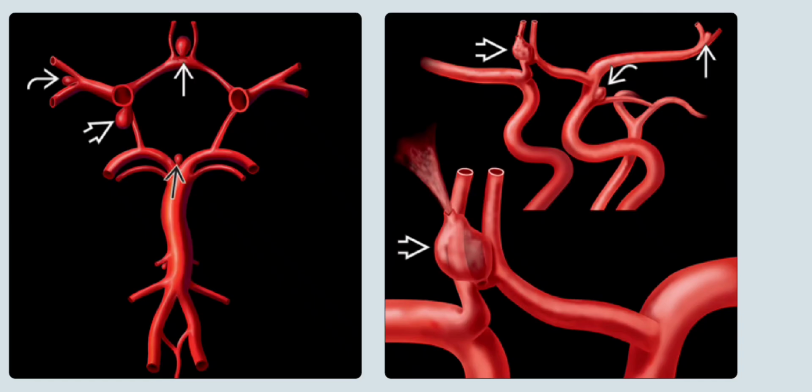So coming towards aneurysms, these are the cases of saccular aneurysms. Left is a graphic showing the most common sites for saccular aneurysms: the anterior communicating artery and the internal carotid and posterior communicating artery junction. The MCA bifurcation and the basilar tip are other frequent sites.